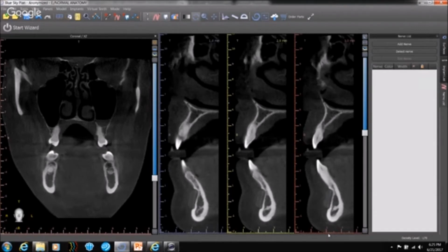So if there's osteoporosis, you would probably see less cancellous bone. In this case, both signs indicate that you have less density of bone, both in the cortical structure and also in the cancellous structure. So that is a clear indication of osteoporosis and osteopenia. Now, what else can we see? You can also see bone marrow spaces.